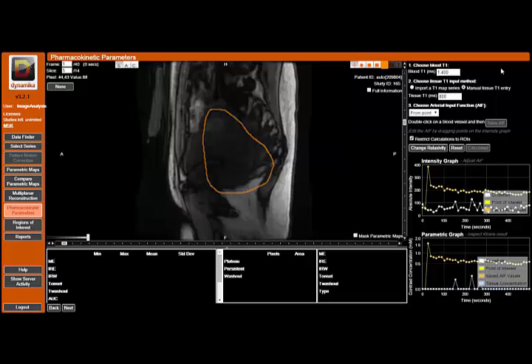First of all, there's a parameter called the T1 relaxation time of blood. This is typically around 1400 milliseconds, but if you have a number that you know is accurate for your patient, you can use that.